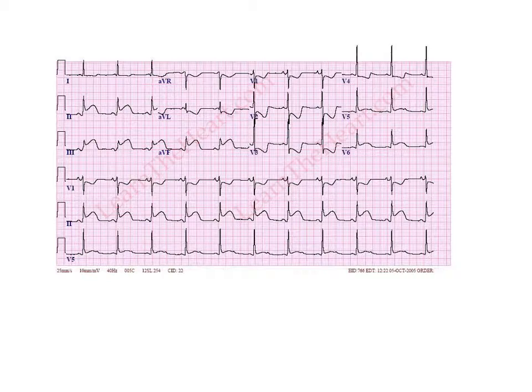So it's sinus rhythm, and it's regular. So, good. What's the rate? There's approximately 4 big boxes in between, so 300 divided by 4, 75. Let's go to our axis, lead 1 and AVF. I notice that AVF has an ST elevation in it, but it's mostly positive, and lead 1 is mostly positive, so it's a normal axis.